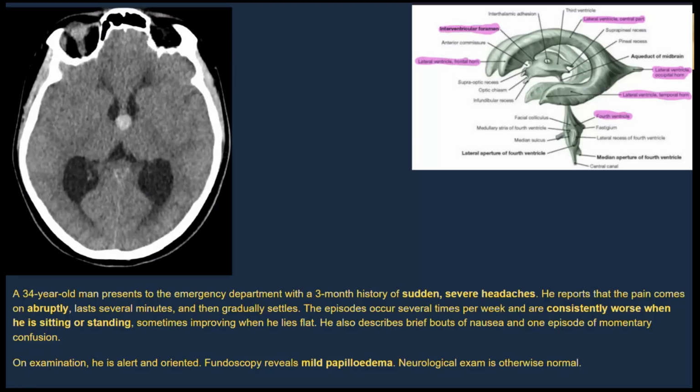So we've got this case here. It's an abnormal CT of the head. It's axial. And then we've got a bit of a history as well. So you can have a look at the image, and then I'll give you a history of this image.